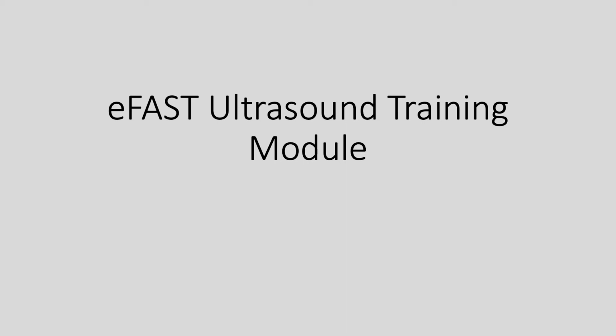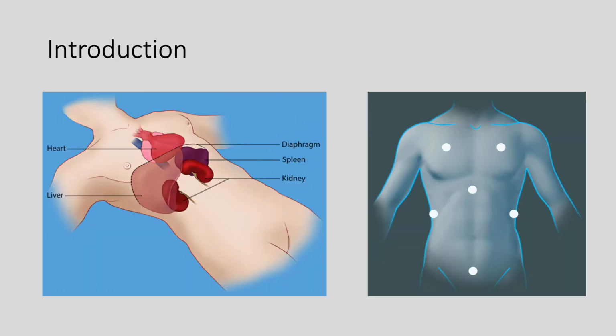Welcome to the EFAST ultrasound training module. The FAST exam is a point-of-care ultrasound exam that was developed to evaluate trauma patients who are hemodynamically unstable and cannot undergo immediate CT imaging. It has been used to evaluate for intrathoracic and intraperitoneal free fluid.